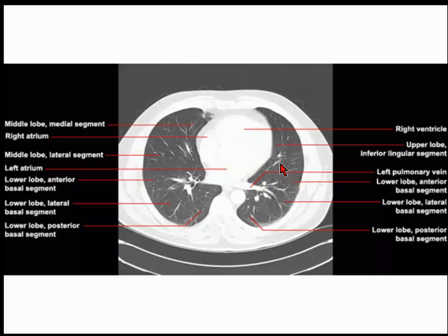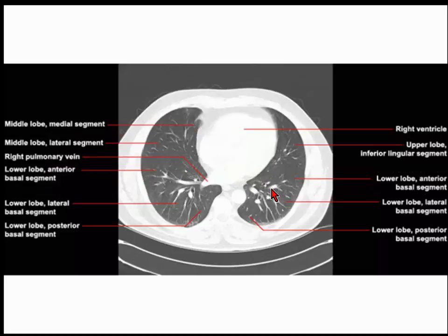And this is lingular. So inferior lingular, the superior has disappeared, and anterior basal, lateral basal, posterior basal. So again, posterior basal, lateral basal, and anterior basal.